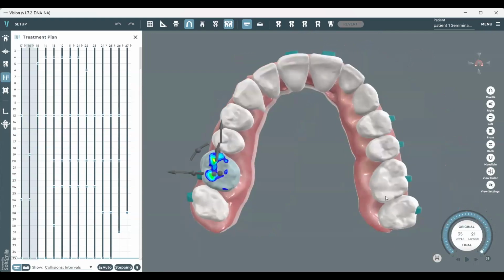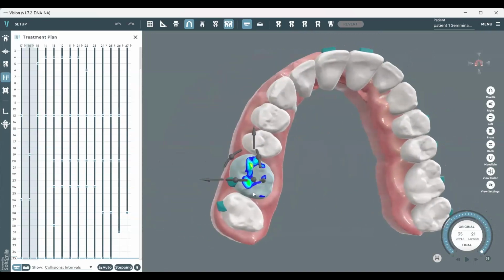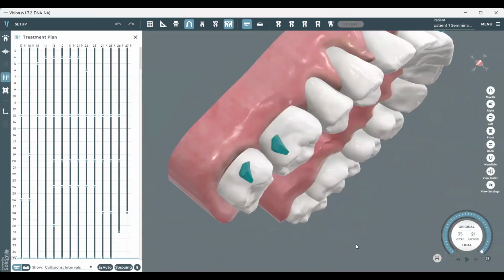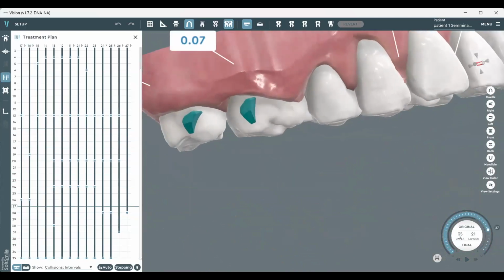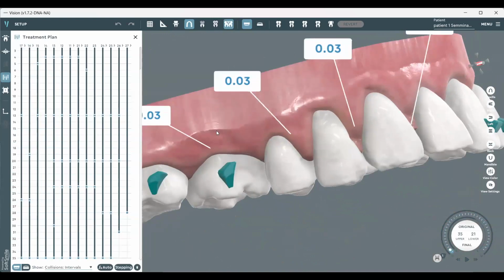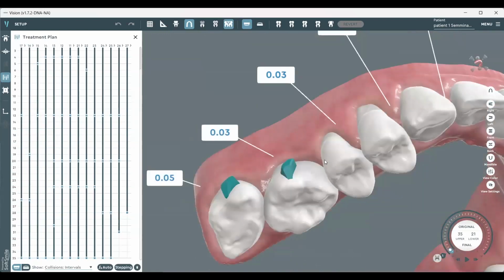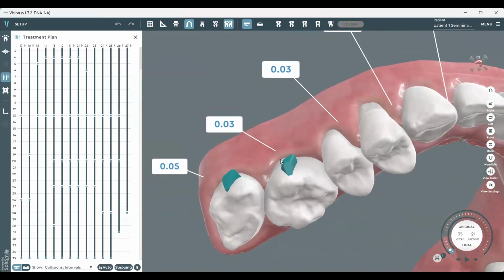Now I want to show you the second quadrant. The second quadrant was done. Oh, sorry, in this part of the rotation, I want to stop there and show you the attachment. Because it's very important that you can see, this is the multiplane attachment. And you can see that the force that I'm going to pass through is going in this direction. So I need an attachment here to assist me with the rotation. Because just to create pressure, remember the aligner pushes, just to create pressure here is not going to be enough to have this big rotation.